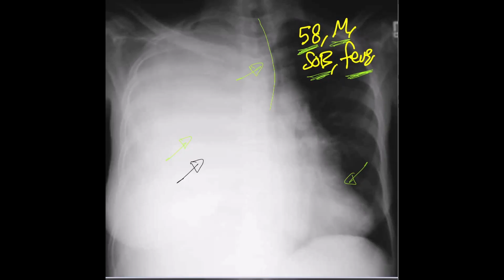Again, if you do a lung ultrasound, that is a very easy differentiation between pleural effusion and atelectasis or pneumonia. But I'm talking now about the chest X-ray, because if it comes in the exam, you will have to know these signs. On a practical basis, you can do a lung ultrasound and easily differentiate between them.